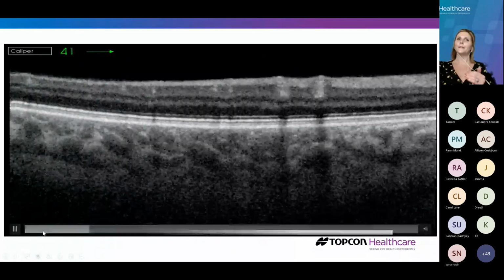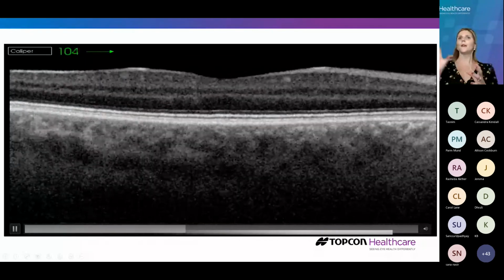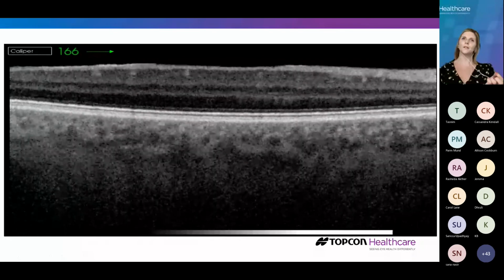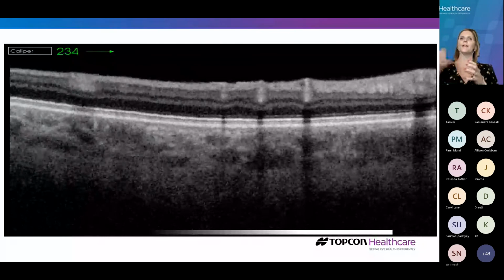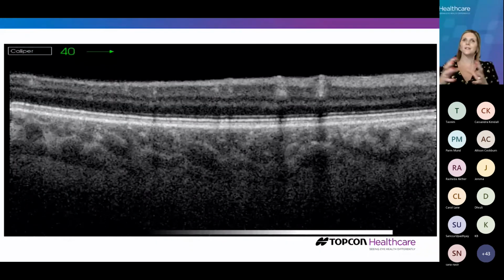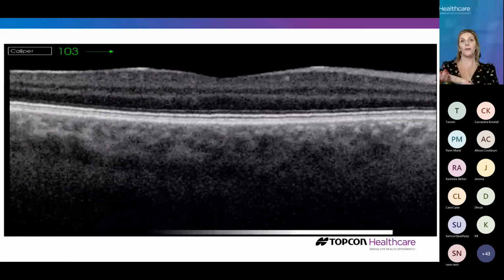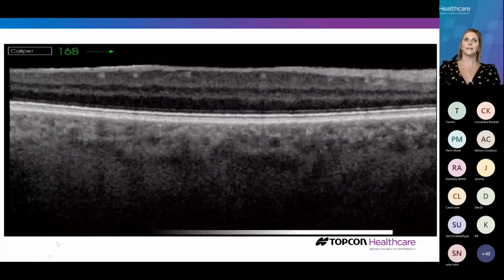Lots of the OCT companies out there also do something called pinpoint recognition, where you're able to pinpoint a point on the fundus and it takes that point to the B scan or vice versa. So don't forget, the majority of them have the fundus photo and the B scan together, and that helps you to start to understand and learn how you might have seen something visually on a fundus photo, and then how you visualize and interpret that on your OCT scan.